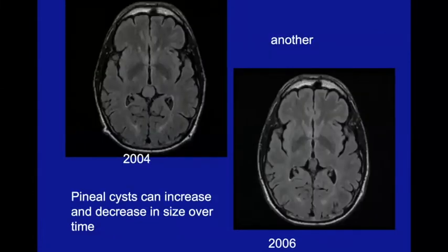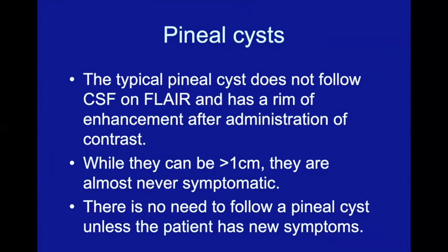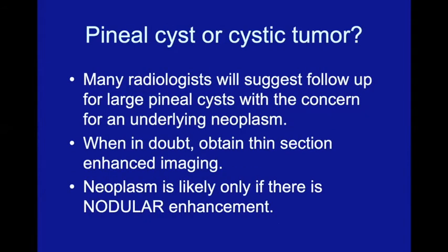Here's a different case. Here it is in 2004. Here it is in 2006. So again, decreased in size over time. These, again, do not follow CSF on FLAIR imaging. While they can be greater than a centimeter, they're almost never symptomatic in my experience. And there's no real reason to follow up pineal cysts once you've made that decision.